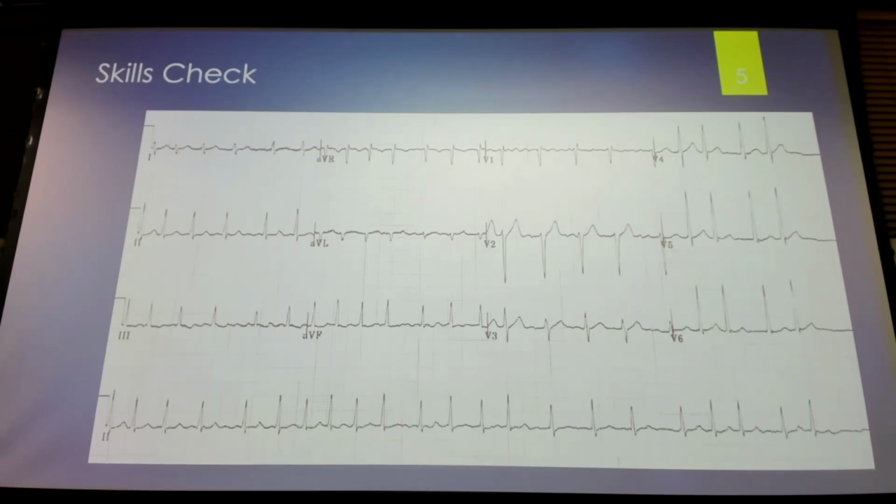Well, that's a good observation, but what you see is, I don't know what I see. Is that a U? Is that a T? Is that a P? And so when we see something like that, we're like, what the heck? What do we call those? Fibrillatory waves. We're not sure what it is.